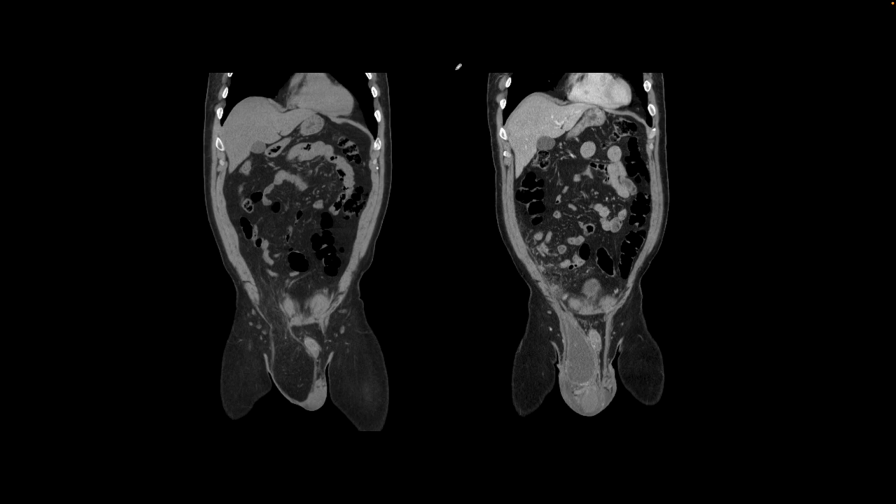This is our next patient. These are two different images from their two different CT scans. Initially, they presented with this large right-sided fat-containing inguinal hernia. We see the fat extending into the scrotum, and after this was treated surgically, they presented with fever, chills, and pain. On their CT at the same level, coronal image shows this collection with rim enhancement extending from the site of the post-surgical changes into the scrotum. So this would be a seroma or an abscess.